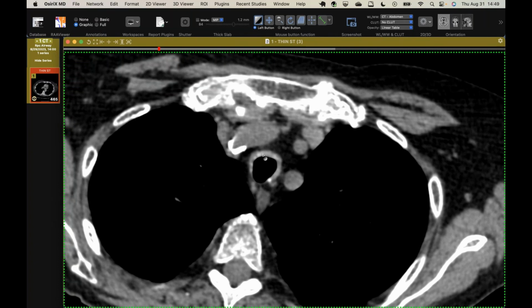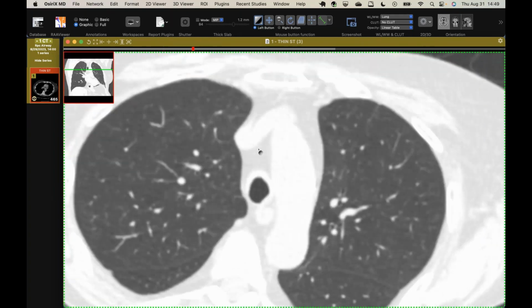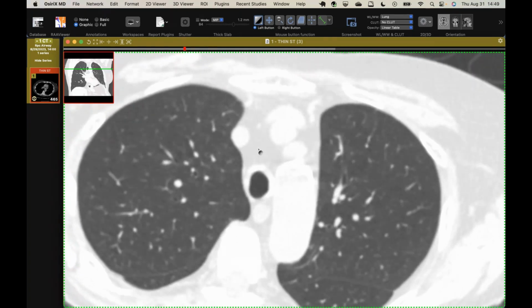Yeah, I haven't seen a ton of cases because it's pretty rare, but the last patient I saw was in his 60s. He had really had it for at least a decade. Yeah, it usually presents more in middle age, but who knows how long she had this for, but it hasn't caused a ton of problems. She does have some respiratory symptoms, and you can see she does have a little bit of bronchiectasis, which may or may not be related. It's very modest.